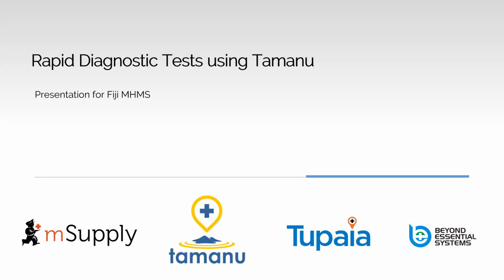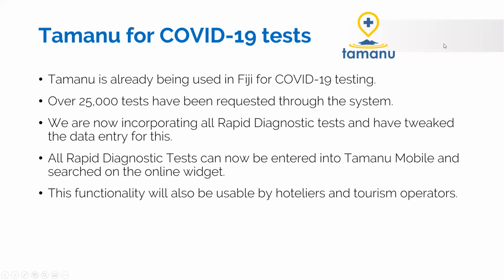Previously, if you just did a rapid diagnostic test on a patient, however, and didn't send any swab sample up to a lab, there was a slightly different workflow for how that was submitted. That was entered via the form rather than entered as a lab request. That's made reporting a little bit tricky because the data is reported in different ways, and it's also a little bit more difficult to train on because it's a slightly different workflow for the different examples. So we have now standardized this across the system, and it's the same workflow now regardless of whether you're doing a normal lab request or a rapid diagnostic test.